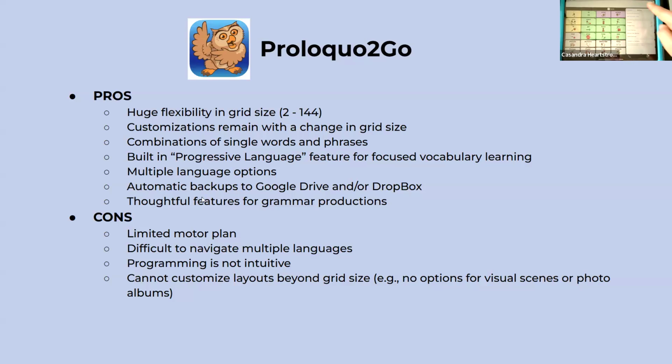And it's got thoughtful features for grammar production. So if I hold this button down, it will let me choose different versions of the word.